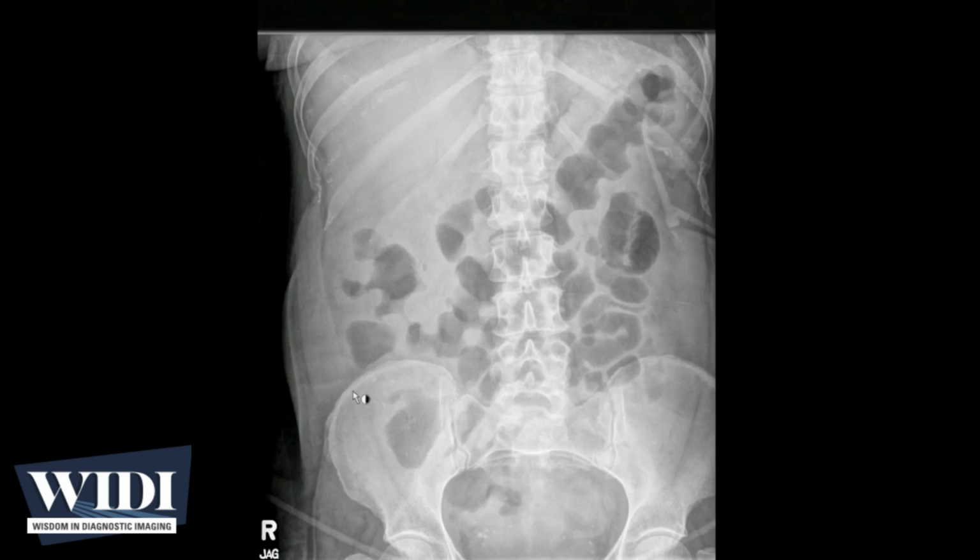On the supine exam, which accompanied this study, you can see that there's a loop of bowel coming across the top of the abdomen here that is consistent with the transverse colon, and there are actually indentations on the wall here, which is also referred to as thumbprinting. And when you see that finding, you need to be thinking about things that might cause edema of the colonic wall. So you want to be thinking about things like infection, colitis, an inflammatory colitis, or ischemia.